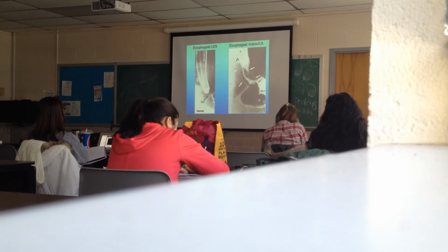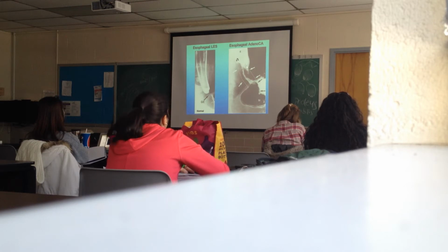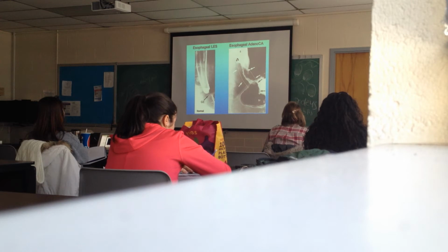There are irregularities in the surface of the adenocarcinoma that allow barium to fill in little crevices. It appears as though there's some barium overhanging the area you'd expect the LES to be in. This actually isn't the LES that's causing the stricture here. This is a cancer causing the stricture.